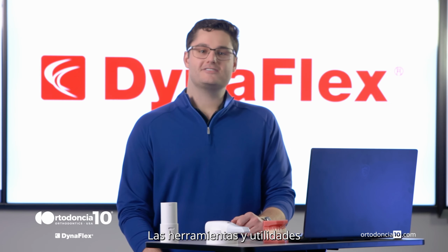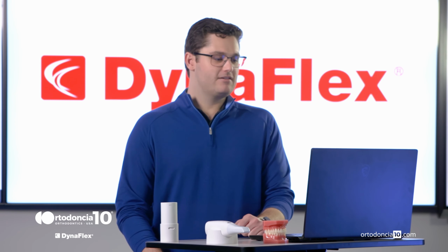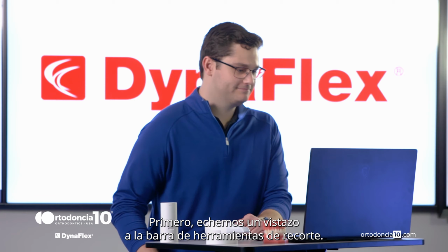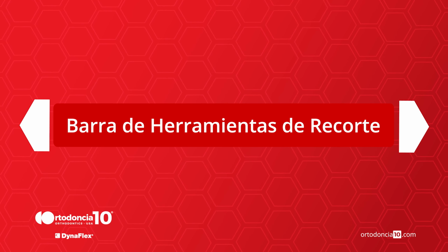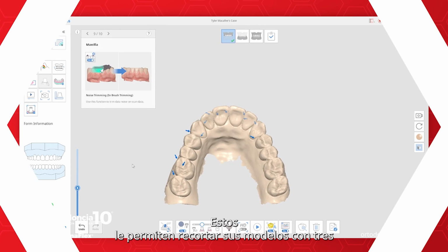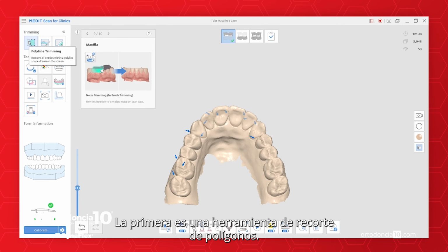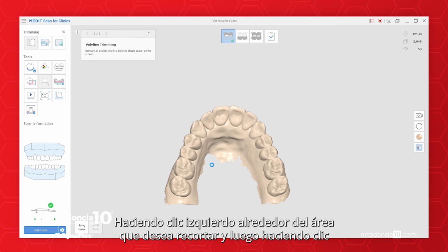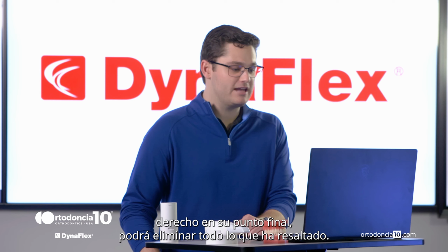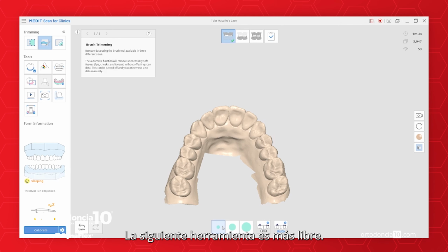The tools and utilities you see in the top left corner can come in handy as well when scanning. First, let's look at the trimming toolbar. These allow you to trim your models with 3 separate tool types. The first is a polygon trimming tool. By left-clicking around the area you'd like to cut out, then right-clicking at your final spot, you'll be able to delete everything you've highlighted.